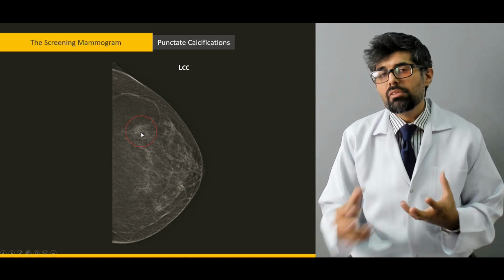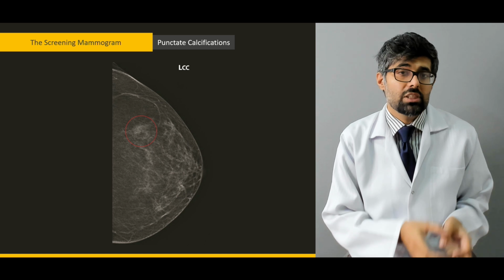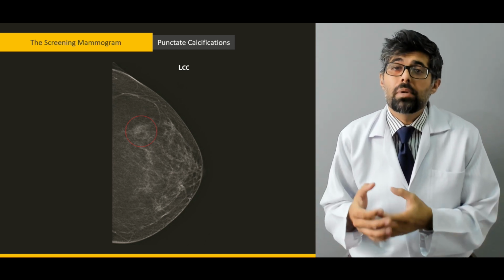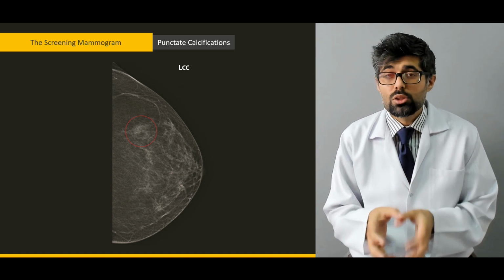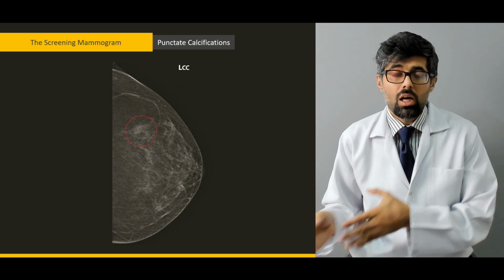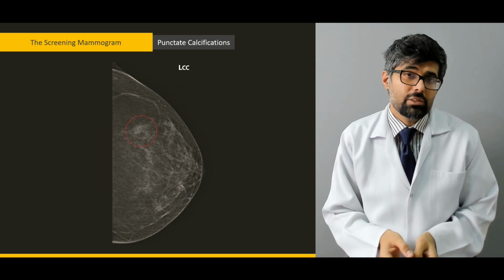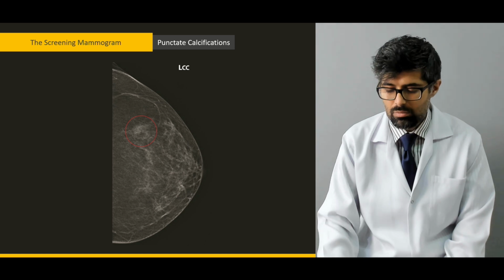Now this kind of calcification usually occurs in malignant tumors and masses, but this can also happen in benign. So such punctate calcification must always be investigated further via biopsies. A histopathological exam will clarify if the calcification is benign or if it's malignant.